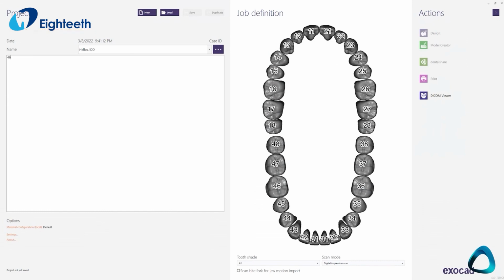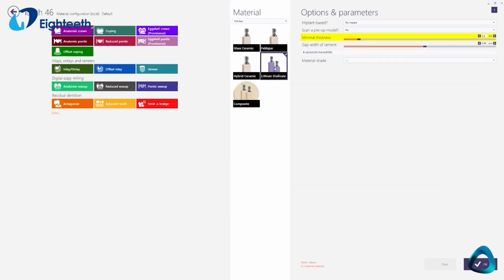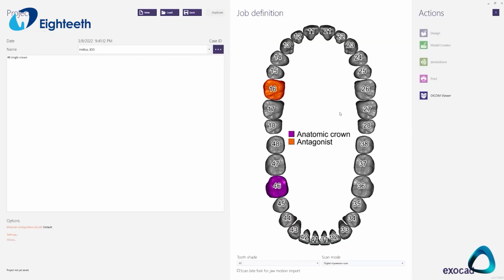Here we have scans taken with a Helios 600 intraoral scanner, and we want to provide a same-day crown to our patient, so we will use ExoCAD software to design and fabricate the restoration. First is the case setup and indications. This is like your lab form. Fill in all the appropriate patient and case details, and then you can move forward with the workflow.